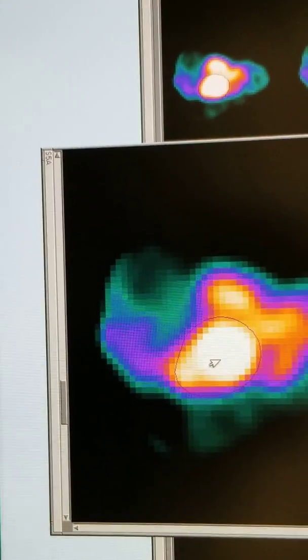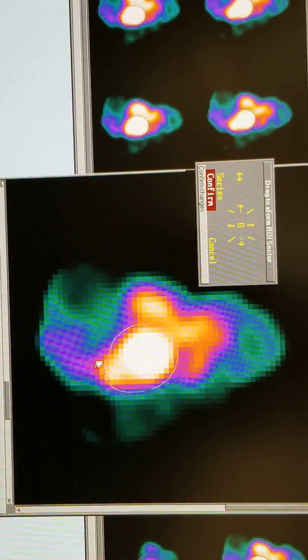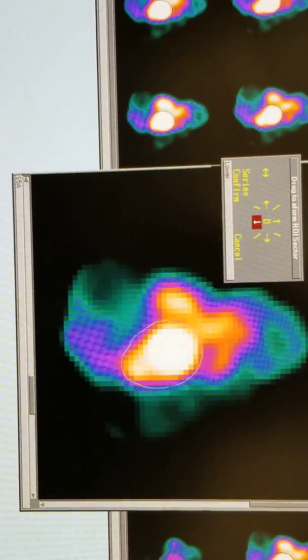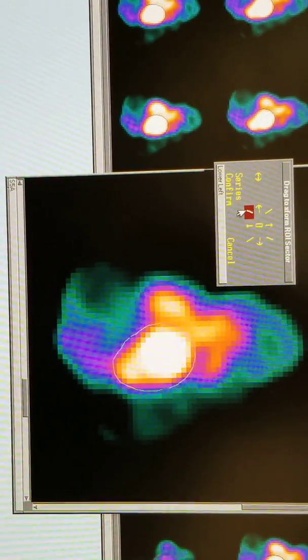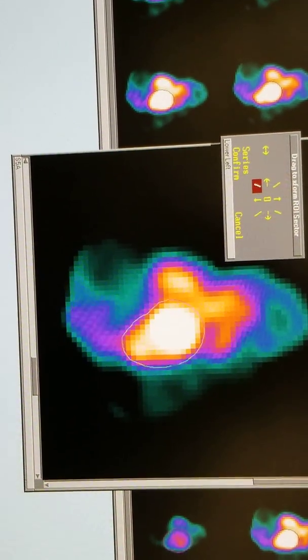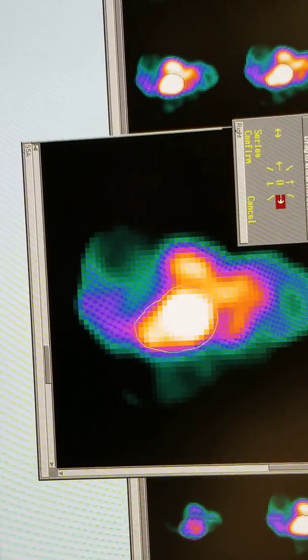Now we're going to Alt and click and get our box back up, right? So we want to capture this little tail here. So grab and hold, move your mouse up and down to capture that tail. Now we've picked up some blue here. We definitely don't want the blue. So click on this oblique and suck it in from there. Again, you're not looking for perfection. We don't have time for that. Make whatever minor changes you want to make.